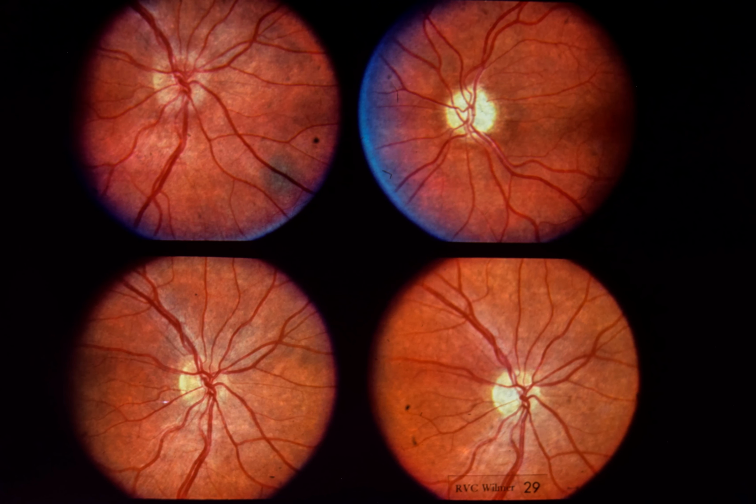Slide 29. Anterior optic neuritis in multiple sclerosis, pseudo-Foster-Kennedy syndrome. This 39-year-old female experienced sudden loss of vision in the left eye 8 years previously. At that time, the right eye had 20/15 acuity and was otherwise normal. The left eye had counting fingers acuity and moderate optic disc edema. Despite steroid therapy, left eye vision rapidly fell to no light perception.